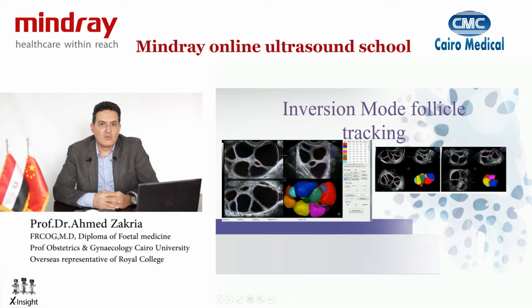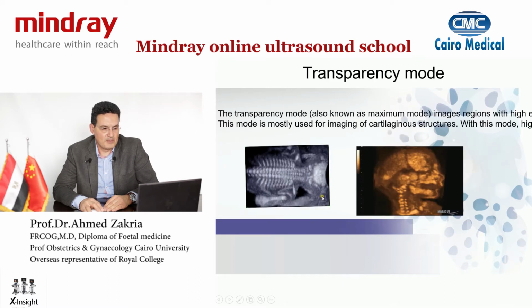So now we've worked on two modalities of the 3D imaging. The first modality was the surface rendering, where you can see structures on the surface, okay? Or we worked on a multiplanar modality like what we're doing here. And then we worked on inverting the quality of what we're seeing, so we can invert the structures, comparing the cystic and the solid structures together, so you can draw them a bit clearer.